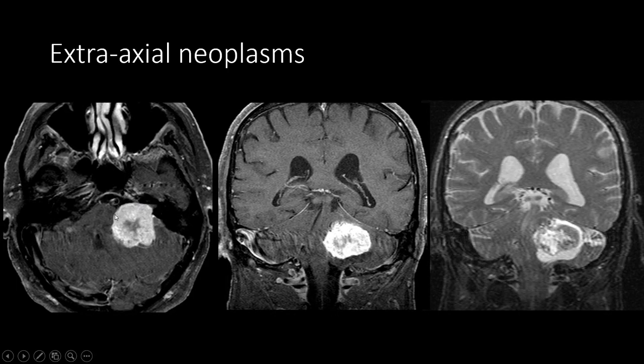Again, another left-sided vestibular schwannoma. In this case, there is a peritumoral cyst along the inferior aspect of the solid enhancing tumor. So we can see here this non-enhancing cyst, which is T2 hyperintense, adjacent to the enhancing tumor.